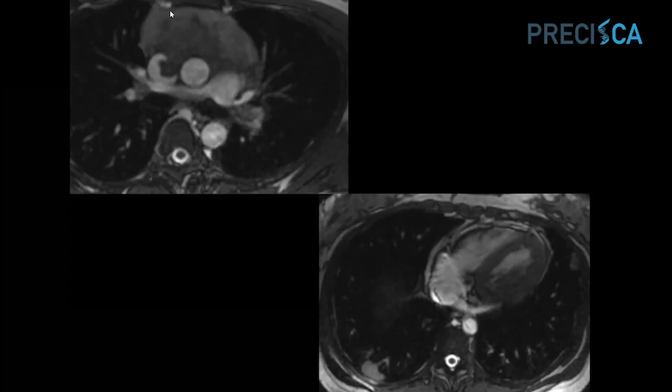Now, when we see that finding, that's pretty characteristic of a lymphoma. So if you see that kind of wrapping around, you know almost immediately you're dealing with some sort of lymphoma. Now, let me tell you also, if you look at the superior vena cava, you can see that there's vascular invasion. MR has much higher contrast resolution than CT, so it doesn't require contrast always to make the diagnosis. Contrast can help, but in this case, because of the patient's pregnancy, we wanted to avoid using that. And you can see that this patient has actually even had an embolism to the left side, and there's an infarct in the right lower lobe.